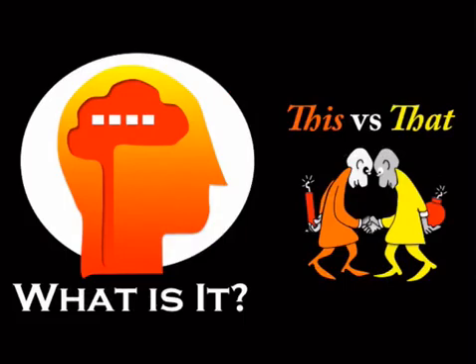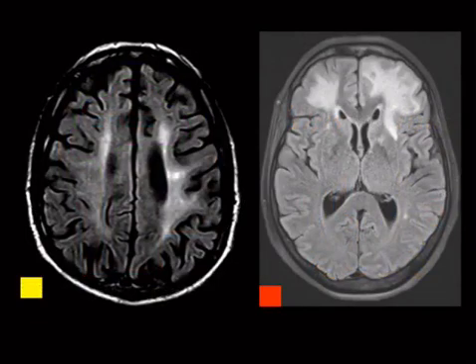Here's another one, compare and contrast. And I'll tell you that this is a person who likes to have sex with male prostitutes without using protection, while at the same time experimenting with IV drugs from needles that he got out of a dumpster. And he also is good friends with Charlie Sheen. And Magic Johnson, played basketball with Magic Johnson. All right, so I'm hinting at the fact that this guy's got AIDS, right?